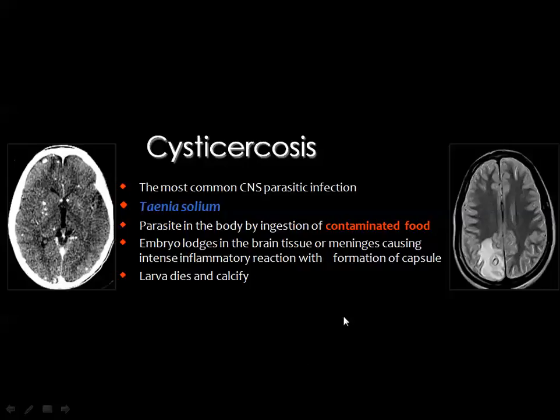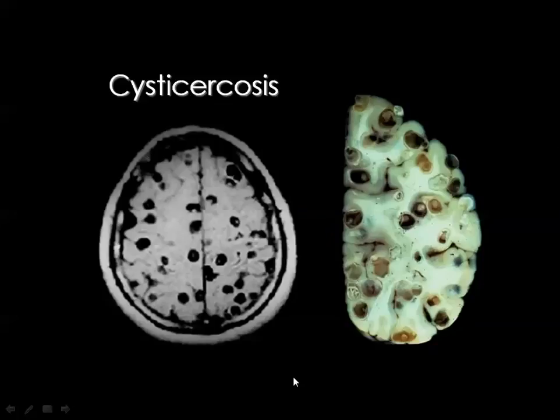Then after the parasite dies, it leaves multiple foci of cerebral parenchymal calcification that are indistinguishable from those resulting from the congenital intracranial infection. The active lesion will be like this one, a small lesion surrounded by prominent perifocal brain edema.